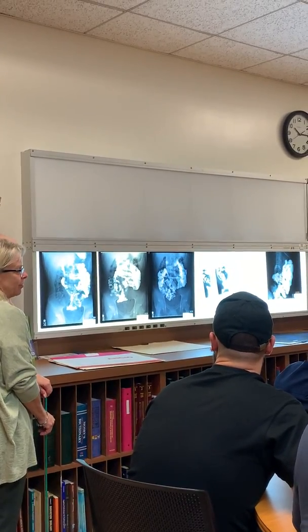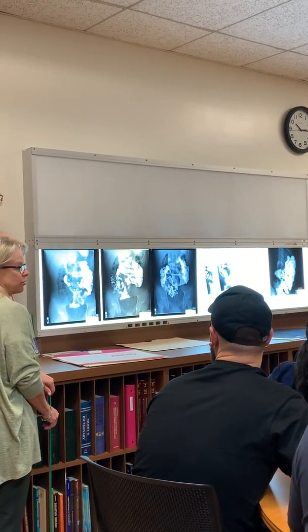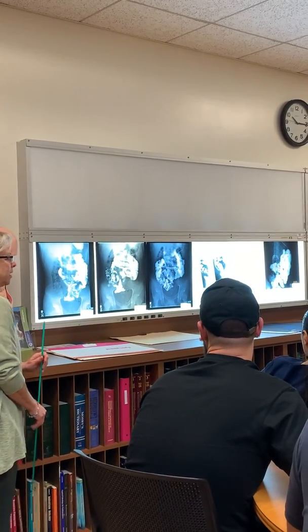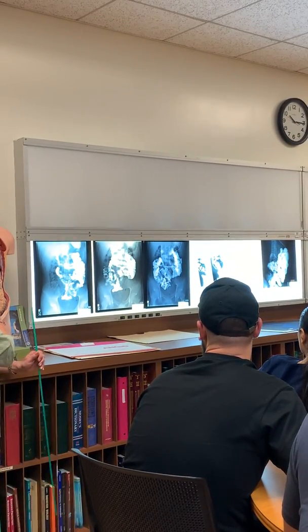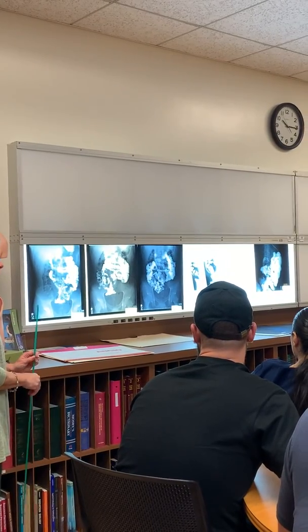Yeah, you're always happy for the ones that go really fast. You see a young person coming in and you think, this won't take long. It seems like the older ones that are bedridden take forever. Sometimes they just take them back up to their room and you have to go back up there and shoot portables.